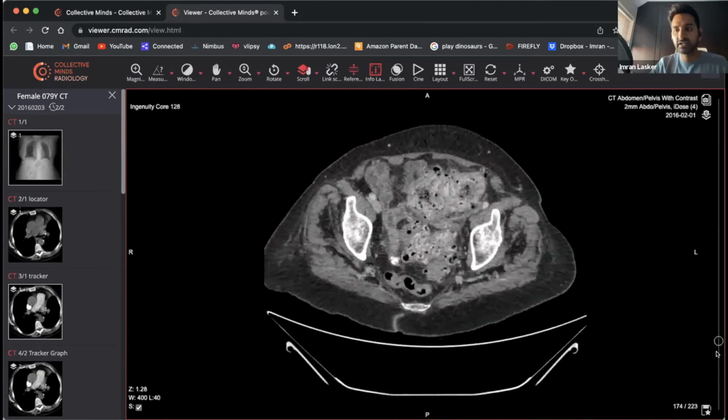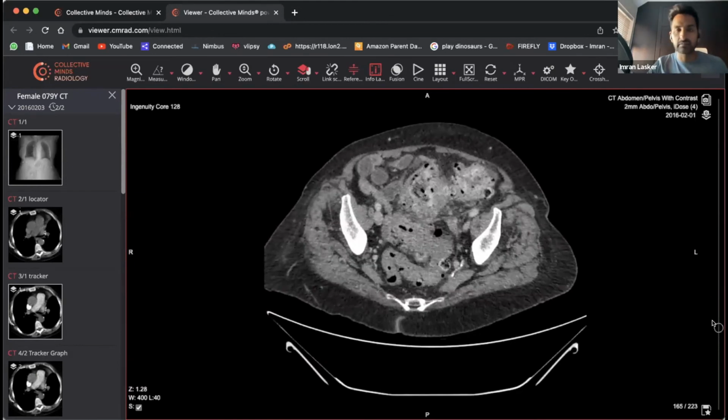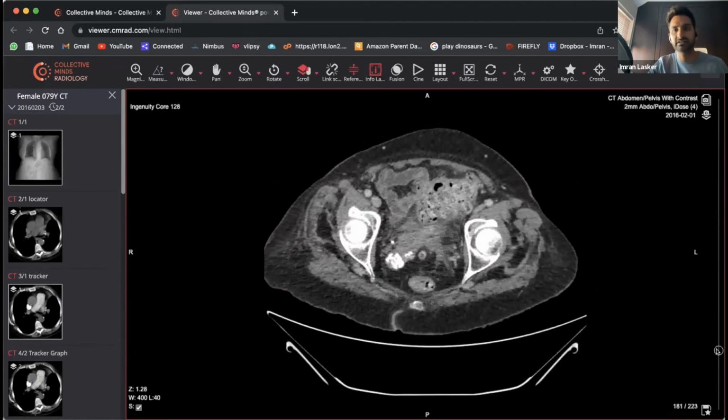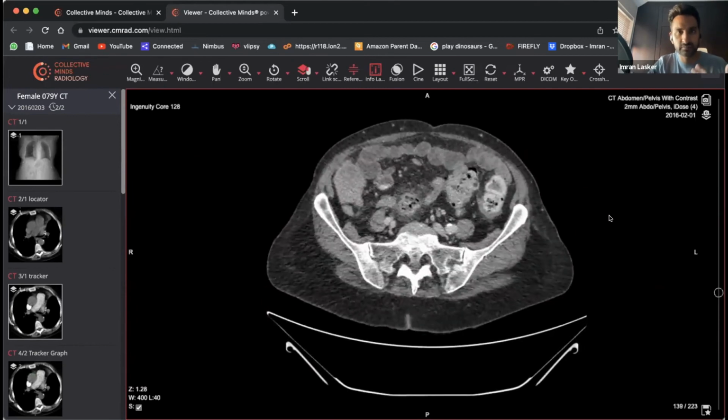So it's quite a useful diagnosis to be aware of when it doesn't quite conform to, I'd say, ischemia, diverticulitis, appendicitis, epiploic appendicitis. When you really think about it, this particular image doesn't conform to any of those things, but there is definitely something wrong, and that's what it is. It's called stercoral colitis. Right.